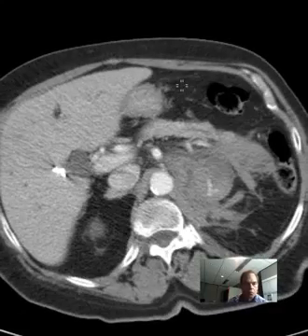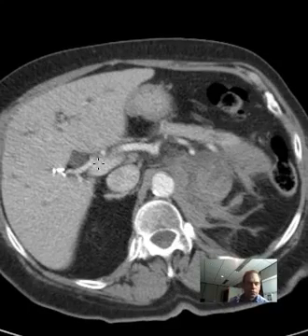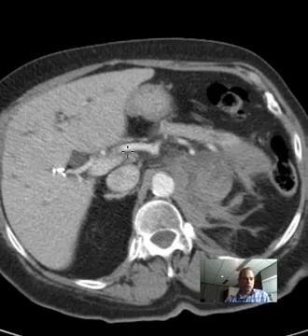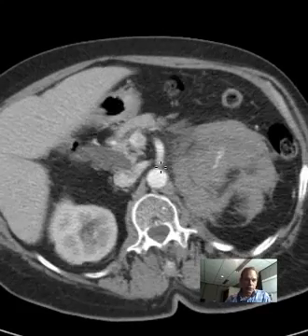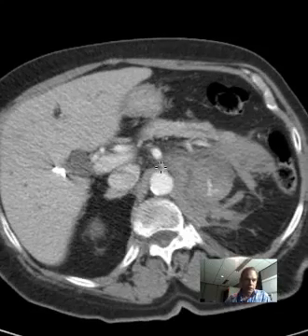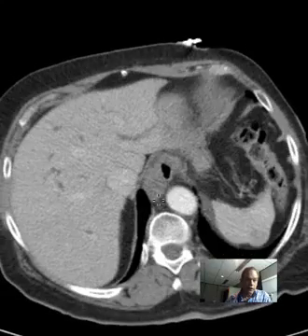Anatomically. Liver. We went through that. Look here, this is the porta hepatis. That's where three major structures course, and they are the hepatic artery. The hepatic artery is one of the branches of the celiac artery. So if we go up here, there's two branches off the abdominal aorta. Going downward, let's go up to the aortic hiatus.